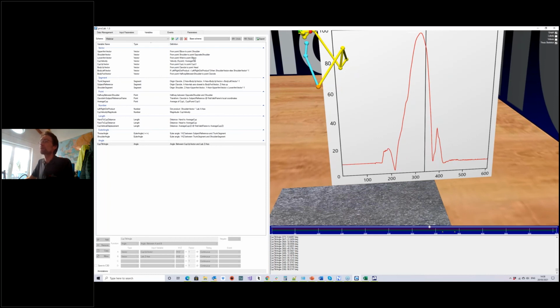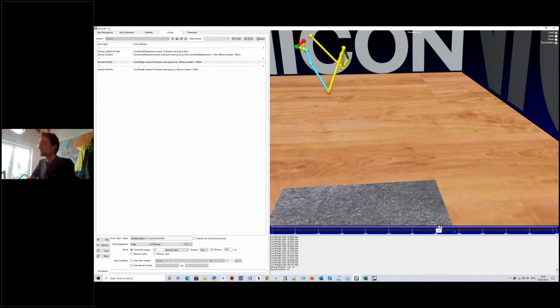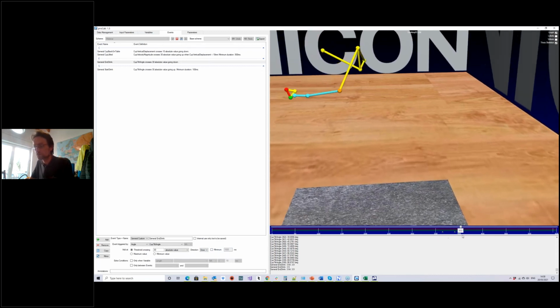Now, in order to avoid this, we could add another condition to the general end drink, such as it has to last for a minimum of maybe 1,000 milliseconds. It is, after all, the only time we want to identify. Oh, well, skip that. That didn't work. That actually got the wrong one out of the two.